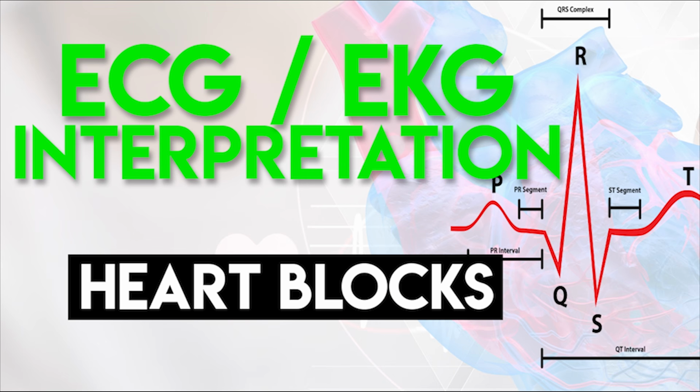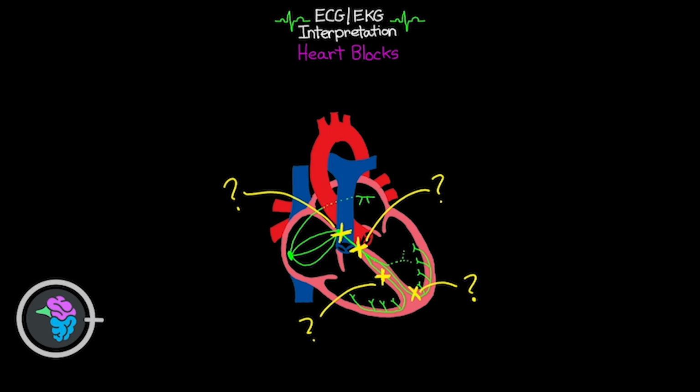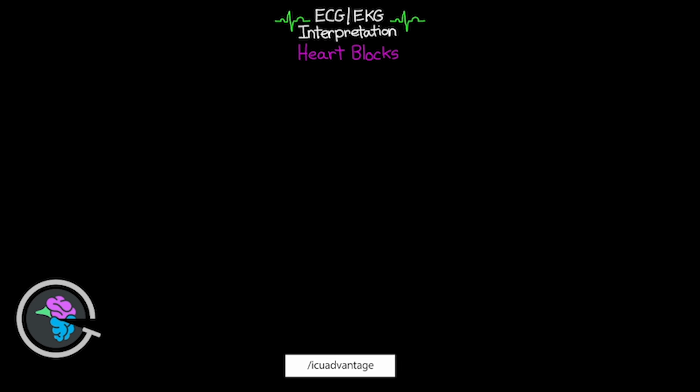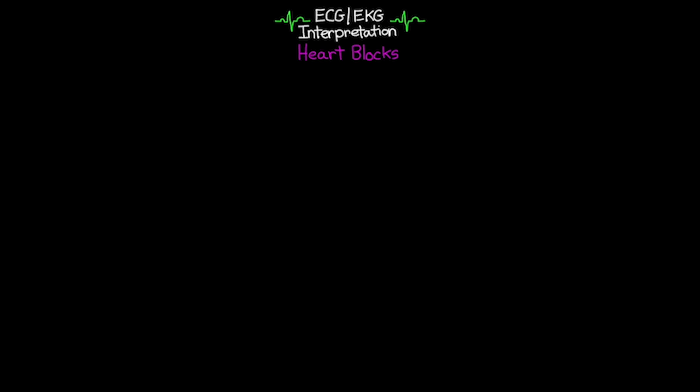All right, you guys, welcome back and congratulations on making it to the last lesson in this series of lessons on ECG and EKG rhythm interpretation. Like I said, in this lesson, we're going to cover the various different types of heart blocks that you're going to find your patient in. For those of you who don't know, my name is Eddie Watson, and I'm going to be your presenter for this lesson. All right, so let's go ahead and get into it.